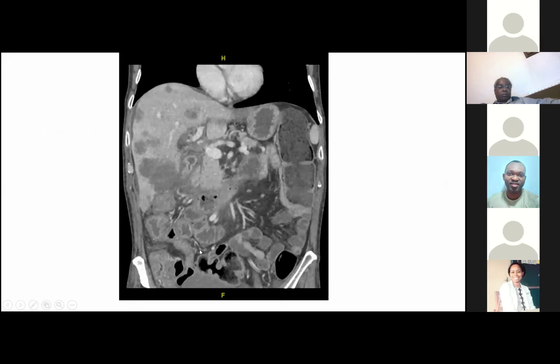So with this patient here, this was a patient at the time they presented, and you can see that when you compare with a plain film, so much more information you get on a CT scan. I know it's a busy looking scan, but there's a liver here in the right upper quadrant. You've got multiple low density lesions in the liver, which are metastatic deposits. And you've got fecal loading here or stasis within the distended large bowel. And the tumor itself is roughly around about here. We're not seeing it very clearly, but there was a tumor in the sigmoid colon which had metastasized to the liver.